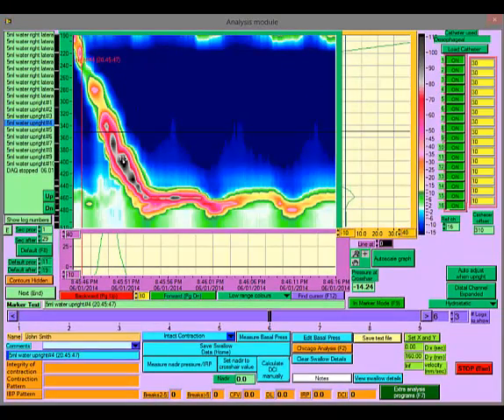This is a reasonable way to move forwards and backwards by short distances in marker mode, for example if a swallow was delayed, but should not be used to move through the study. Other markers will not be shown when you move forwards or backwards in marker mode.